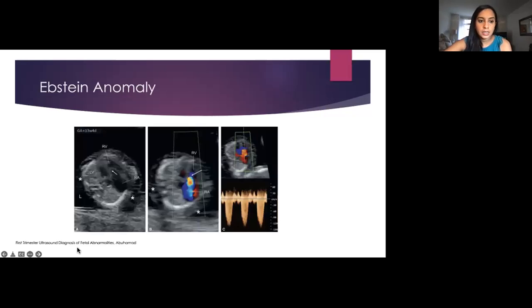And then here in ultrasound images, you can see that your right atrium is dilated only in severe cases. Your color Doppler will show the significant regurgitation jet, and then when you Doppler that area, you can see Doppler flow of the regurgitant jet across a dysplastic tricuspid valve.